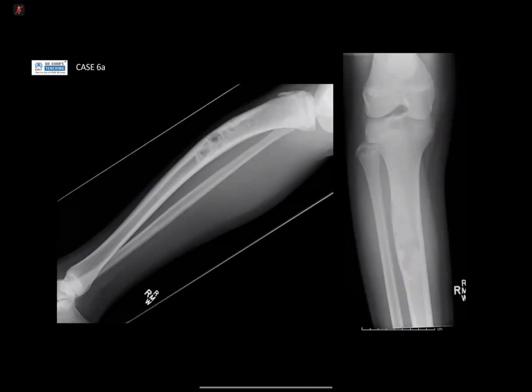I think this is candidate 2. Yeah. So, given the lateral and frontal radiograph of the knee joint and proximal leg, and a full leg lateral view of a skeletally immature patient, I see multiple very different lucencies in the proximal metadiaphyseal region of the tibia, with sclerotic margins.